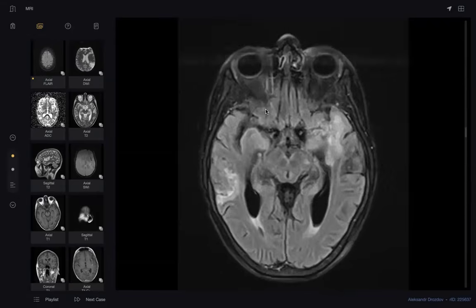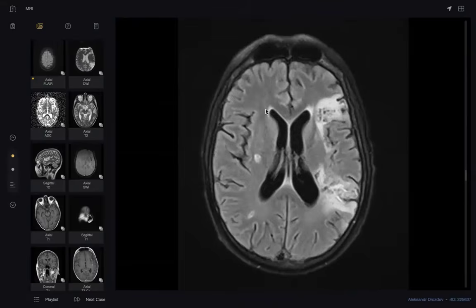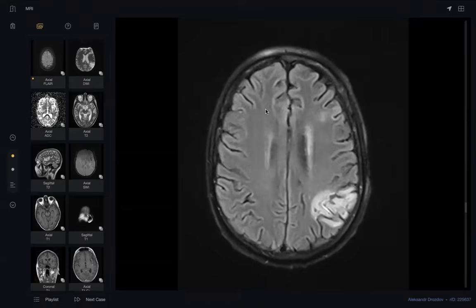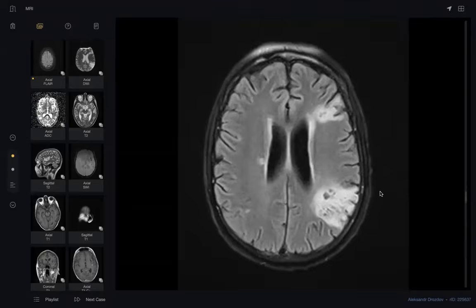I think the abnormal signal is also extending in the subarachnoid space at this level, apart from the cortex, and this did not show any diffusion restriction. Now you told me there is a granulomatous disease, and I agree with you. What's your explanation for the finding here?